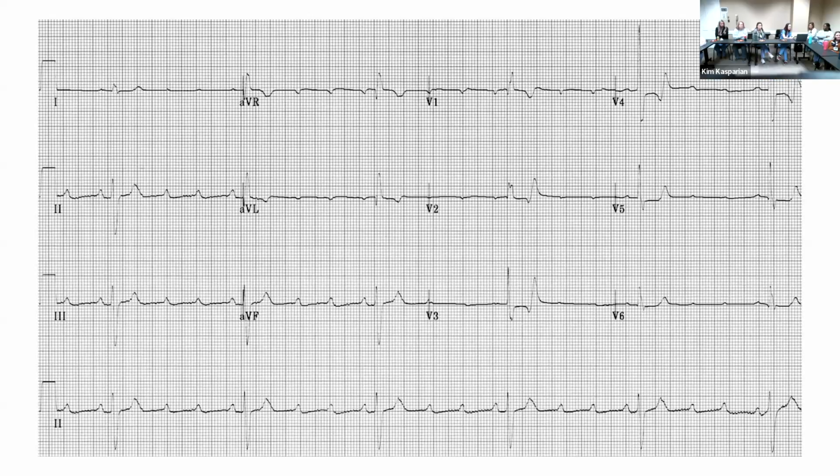Do I have someone on Zoom? Kind of 3-to-1, 4-to-1. It almost looks like Wenckebach, but they're regular enough as far as when the beat gets dropped that it looks more like type 2. So the PR interval looks pretty consistent, right? I sent this PowerPoint to my wife shortly before this, and she actually disagreed with me on my diagnosis, but said it didn't really matter.